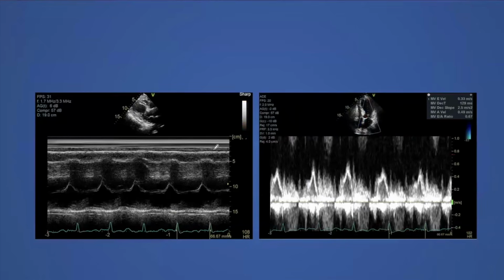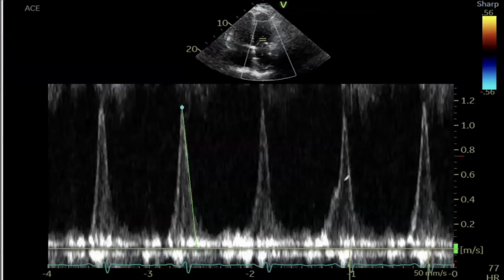So, as from the previous things, the M-mode and the pulse wave both are connected. Like for example, in this patient, you can see it as one. I think you can see it as one because of, for example, tachycardia, prolonged PR, and here you will have the same issue. So whenever you have a problem with one side, you should revert to the other one. You see how things are going. The same with this patient. What's happening here?